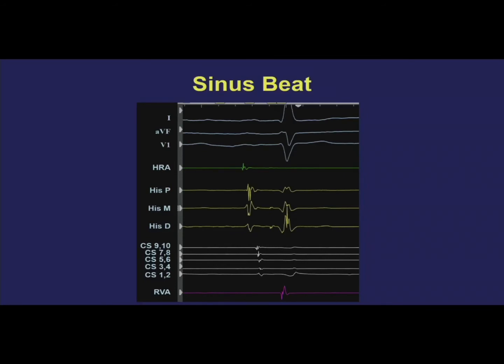Truth be told, whoever asked that is spot on, that really the local activation time is the first sharp deflection rather than the onset of the bipolar recording. So you probably should take the sharp initial deflection, not the upslope or the downslope of that recording, but the sharp deflection is really when the wavefront is passing between those two electrodes.